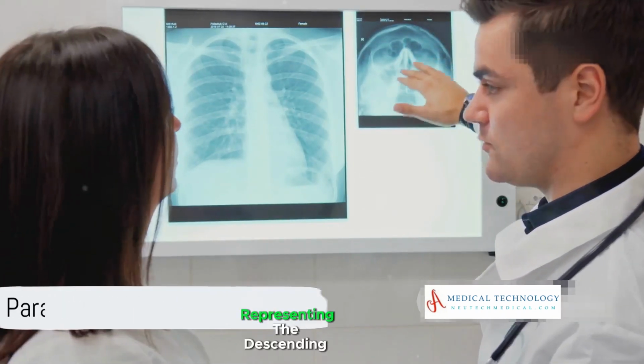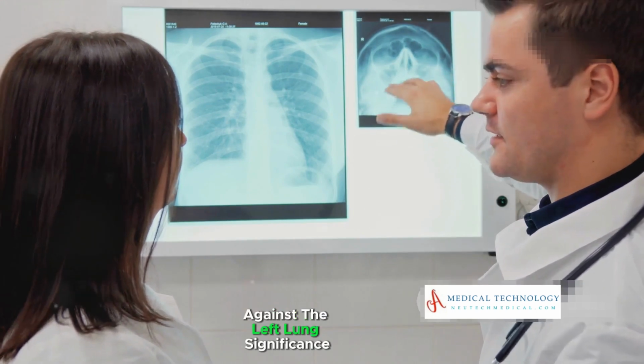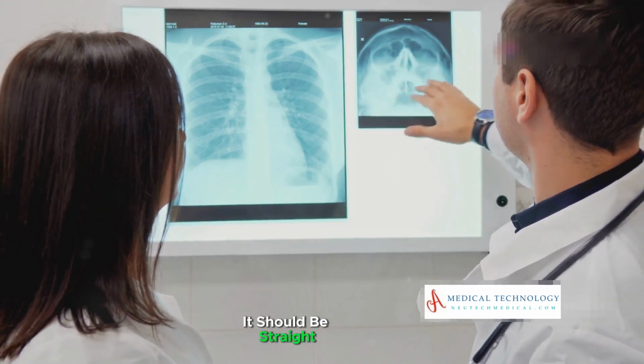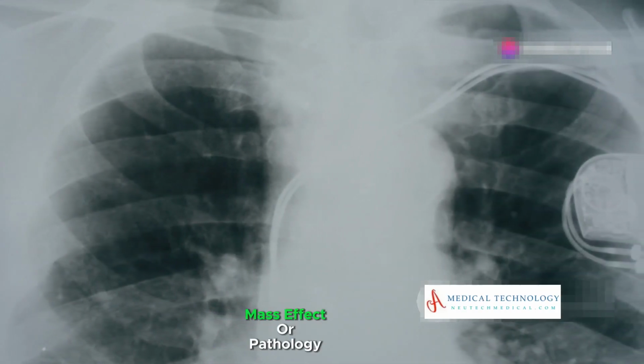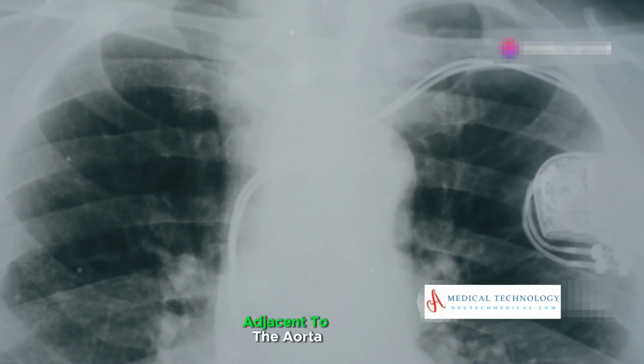Para-aortic line. A vertical line representing the descending aorta against the left lung. Significance: it should be straight. Abnormalities or deviations may suggest aortic aneurysm, mass effect, or pathology adjacent to the aorta.